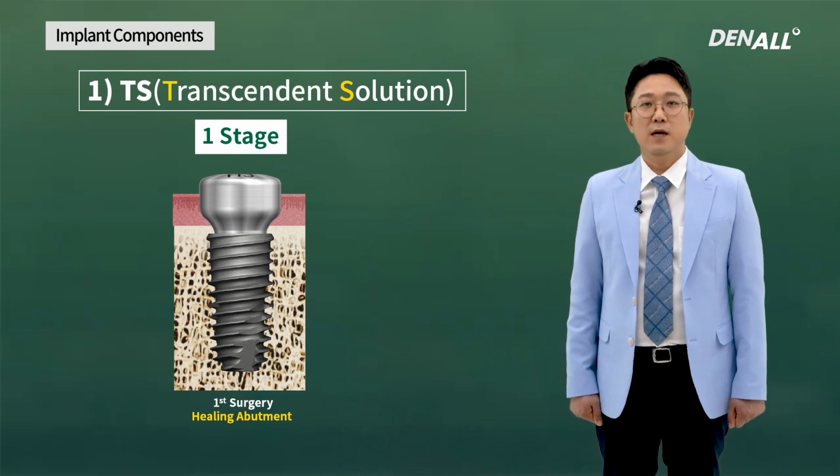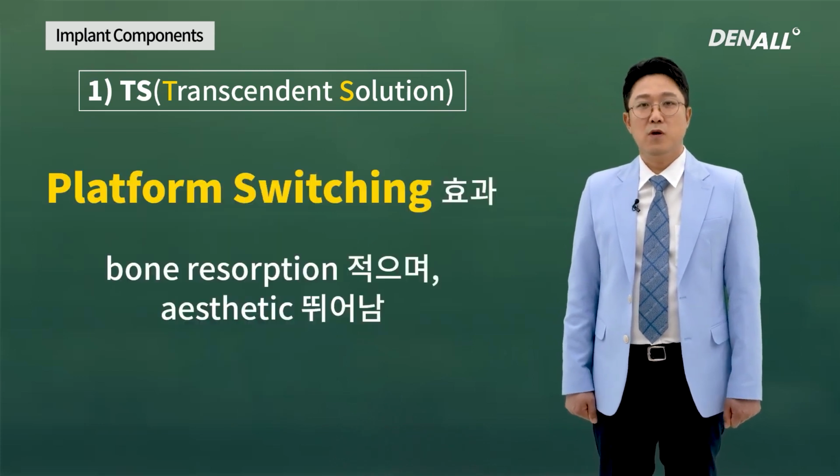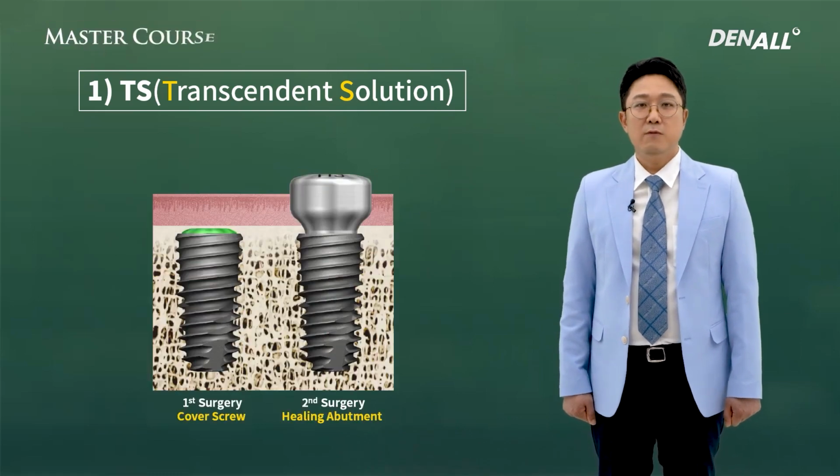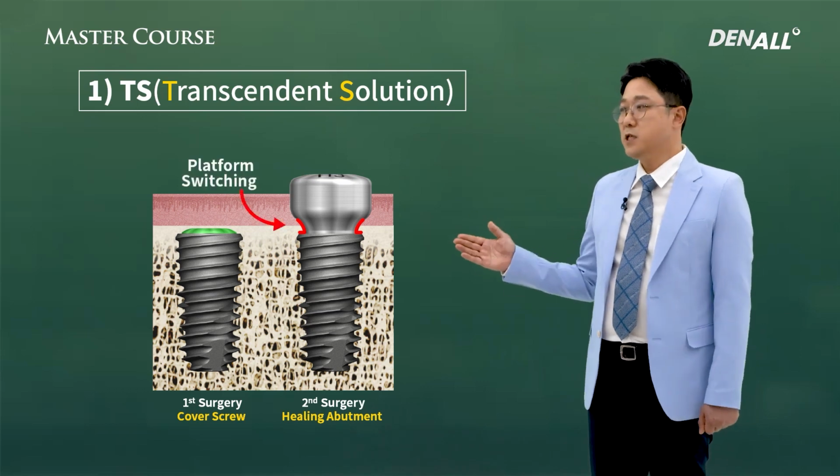The TS implant has the advantage of the platform switching effect. When you connect the superstructure on the fixture, structurally, you can do platform switching.